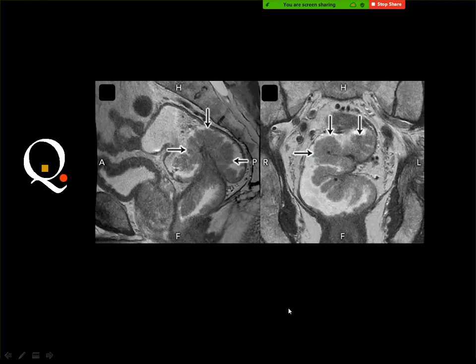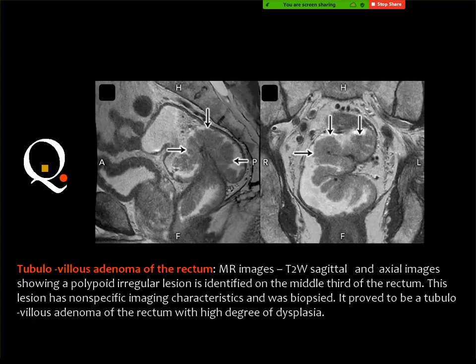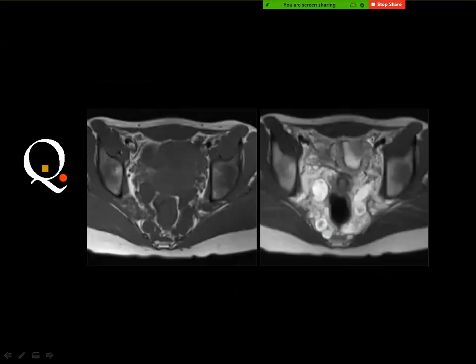Cauliflower. Yes. You remember the villous adenoma of the rectum, which looks like a carpet? Tubulovillous adenoma. You remember it? This is a very characteristic appearance, which is frond-like, a big cauliflower lesion with distension of the rectum. This is a benign lesion with a very characteristic appearance. Okay.